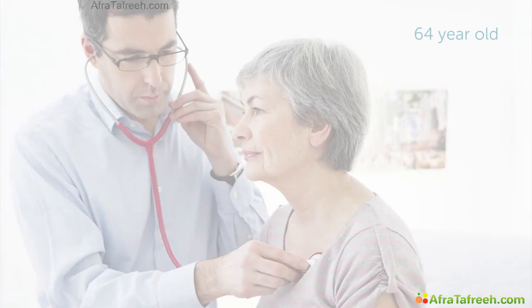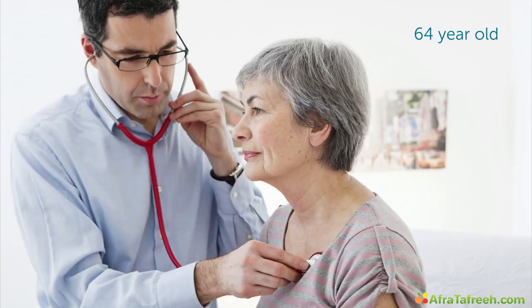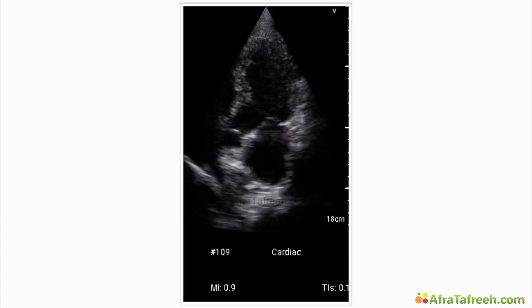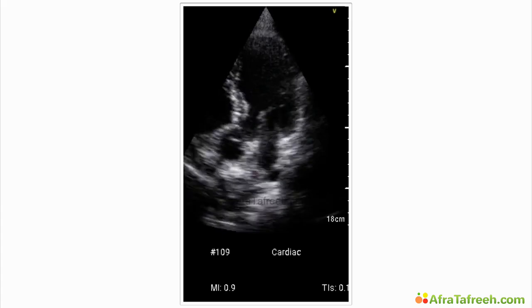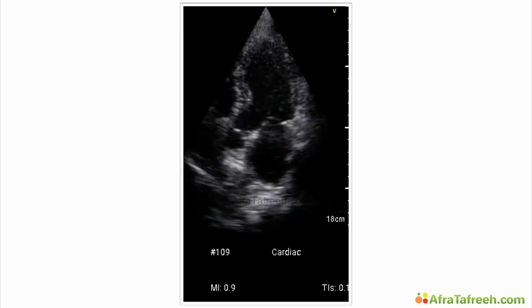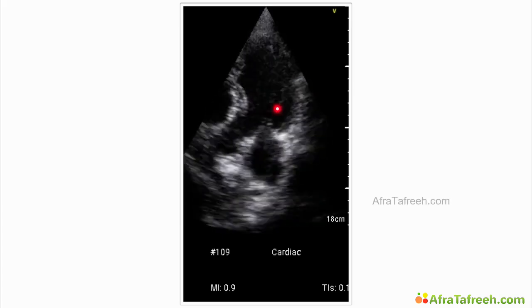Of course, you cannot rule it out 100%, but if all the other findings are negative, he simply does not have myocarditis. You perform a routine medical checkup in a 64-year-old. You do hear a systolic murmur. Now you perform an echocardiogram, and this is the 4-chamber view that you see. Now this might not be so evident, but left ventricle function is not normal in this case.